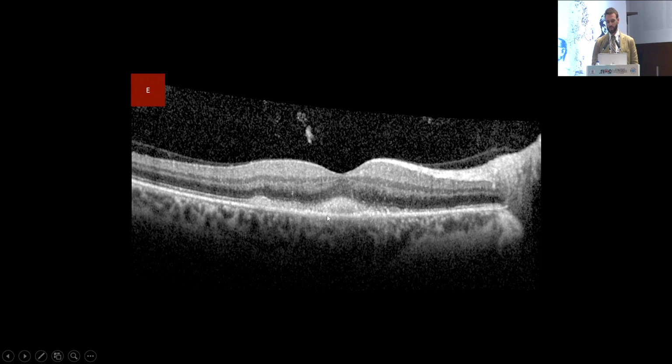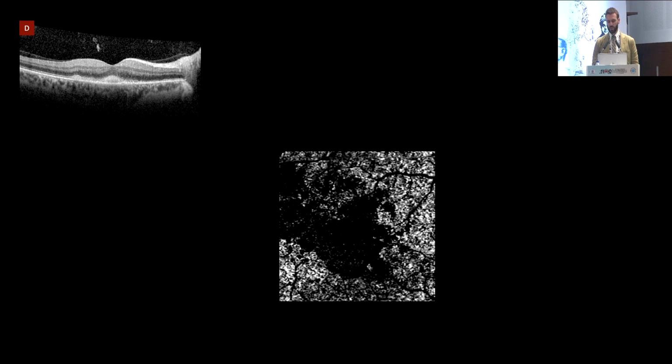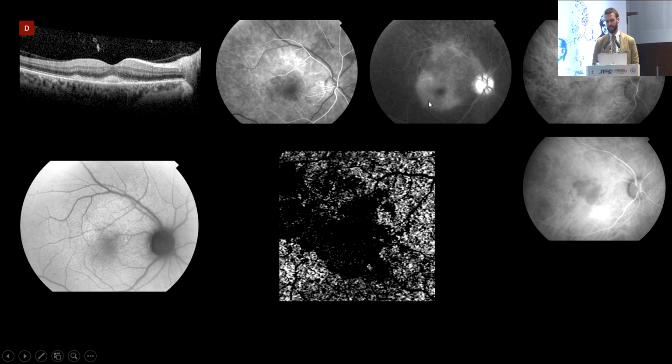which is between the RPE and the photoreceptors. And the patient, on OCTA, has a kind of non-flow at the level of the choriocapillaris. On autofluorescence, you don't see a lot. Maybe you see a diffuse hyper autofluorescence here. ICG is showing us some hypoperfusion in the center, and what's quite telltale in this patient before getting any test is this plaque of hyperfluorescence in the macula with the edges that are slightly leaking.